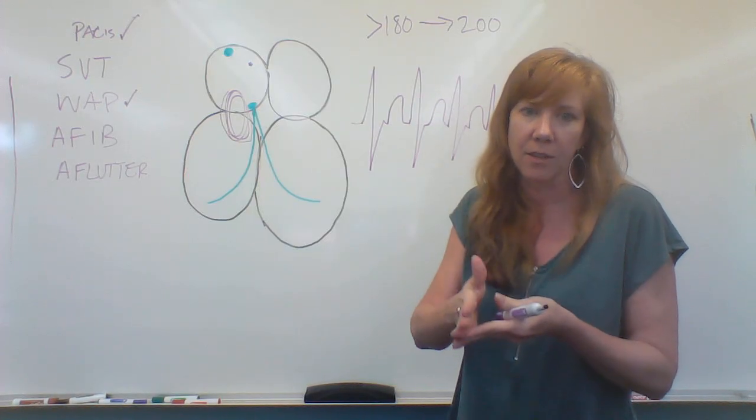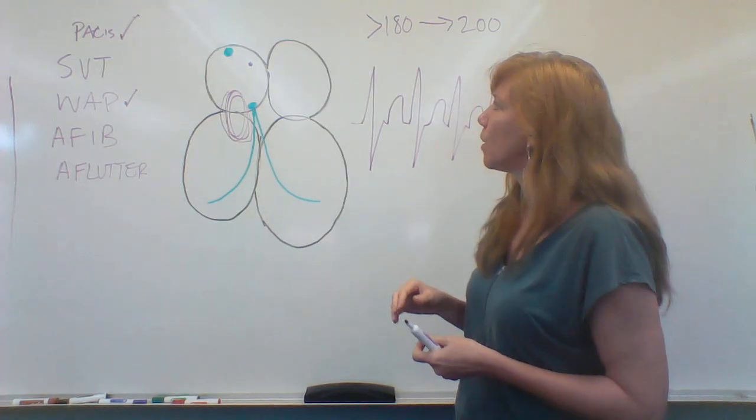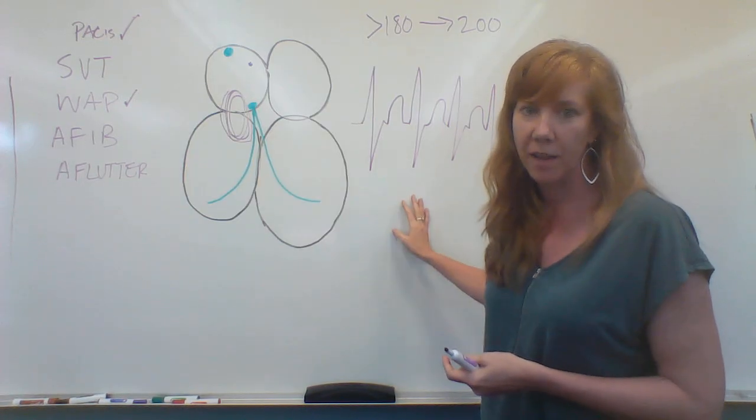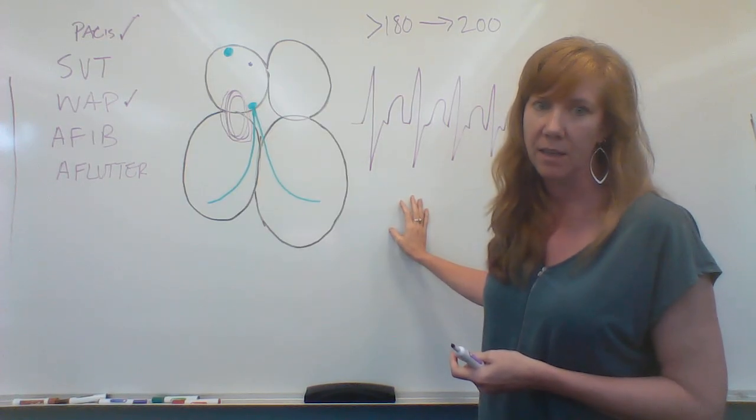And it goes back to sinus rhythm. So it's paroxysmal, begins and ends suddenly. High heart rate and morphology. That's how you're going to know it's SVT.